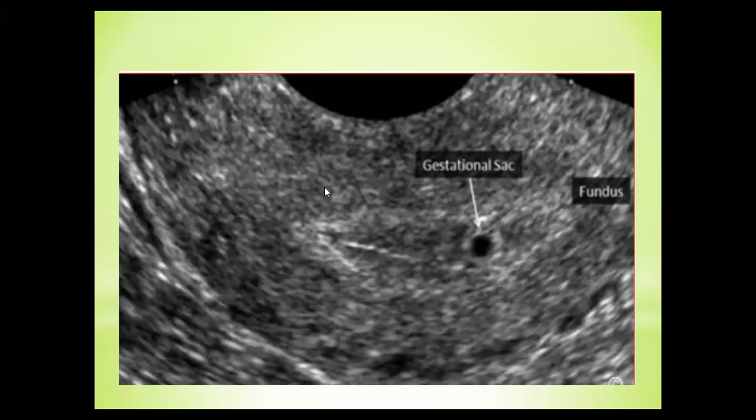Gestational sac. How to diagnose presence of gestational sac intrauterine? It is very important to diagnose pregnancy. This is a picture of a small gestational sac intrauterine.